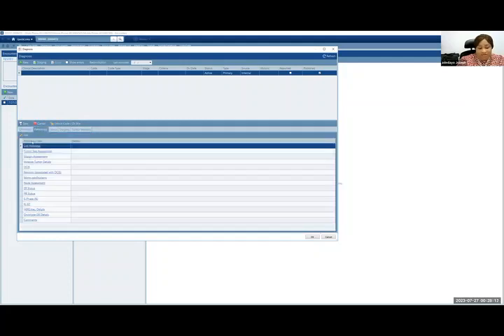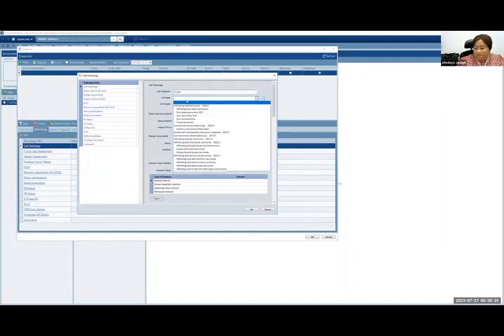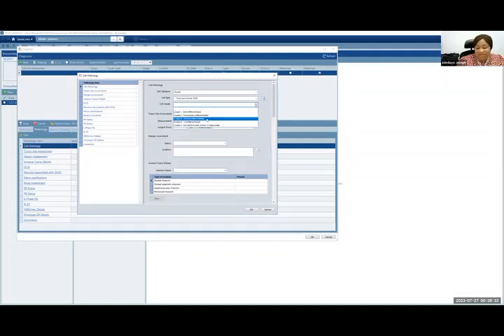And that's definition. Now going to pathology, again, you click on this first column here and you select the type. So again, I'm going to use the most common thing. So this woman has a ductal carcinoma, and I'm going to say the type of ductal carcinoma. It is usually duct carcinoma, not otherwise specified, that I put there. And then the grade.